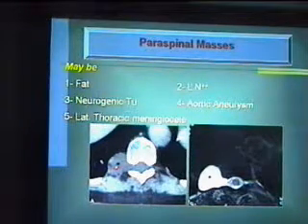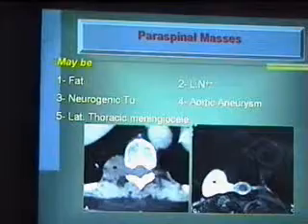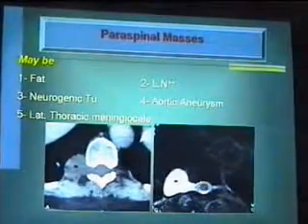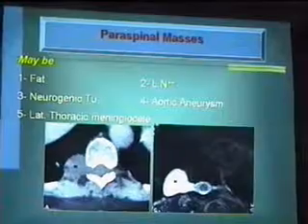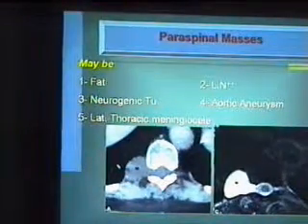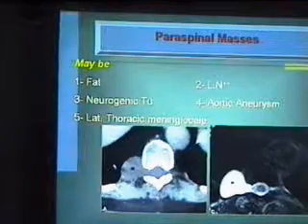This is a mass that is a paravertebral mass وله connection مع السباين فممكن يبقى neurofibroma. أيوه ممكن neurofibroma. على T2 واخد الـ signal intensity around اللي هو بتاع CSF. Okay? So that's a meningocele. شوفوا على الـ CT scan يا جماعة we cannot differentiate between a meningocele and a neurofibroma. لكن على الـ MR we can easily discriminate because of the CSF signal intensity.